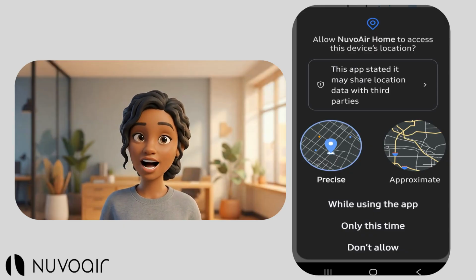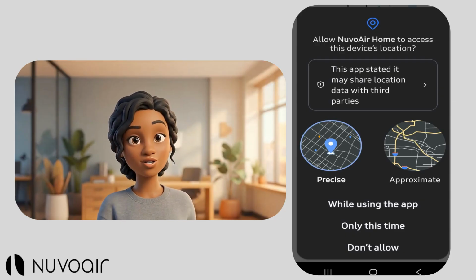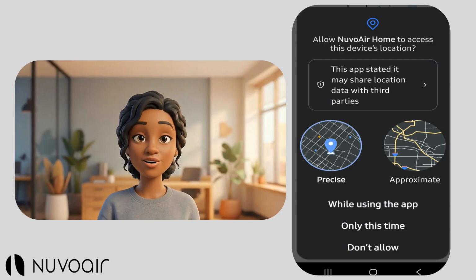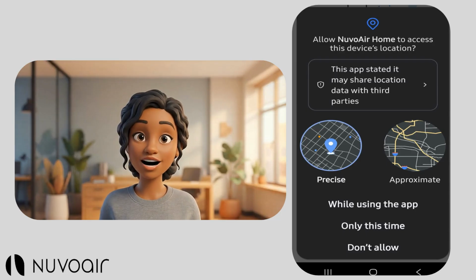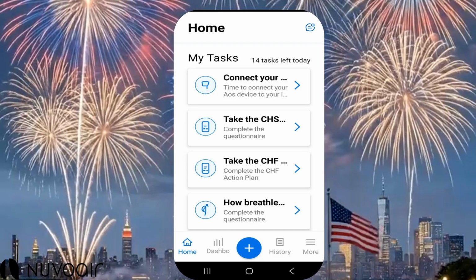Awesome! Next, the app is going to need you to enable your device's Bluetooth. I always select while using the app, but you can choose that or only this time. Whatever is best for you. Bluetooth connects your spirometer to your phone. We can pause here for a second if you need to. I will be ready to move forward when you are.